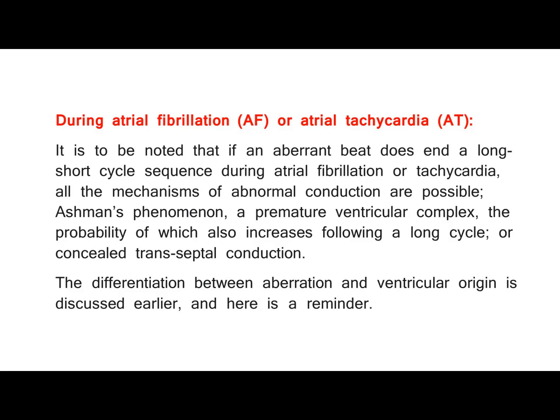It is to be noted that if an aberrant beat does end a long-short cycle sequence during atrial fibrillation or tachycardia, all the mechanisms of abnormal conduction are possible: Ashman's phenomenon, a premature ventricular complex, the probability of which also increases following a long cycle, or concealed transseptal conduction.